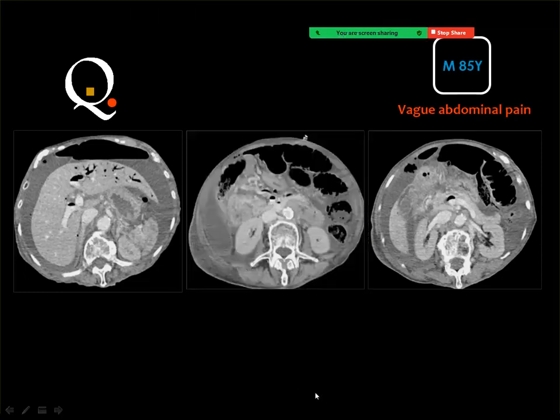There is pneumoperitoneum. Yes, and pneumobilia. These are the bile ducts in the periphery of the liver, or the portal venous radicals? Portal vein, yeah. Mesenteric ischemia, doctor? Yes, and the answer is right.